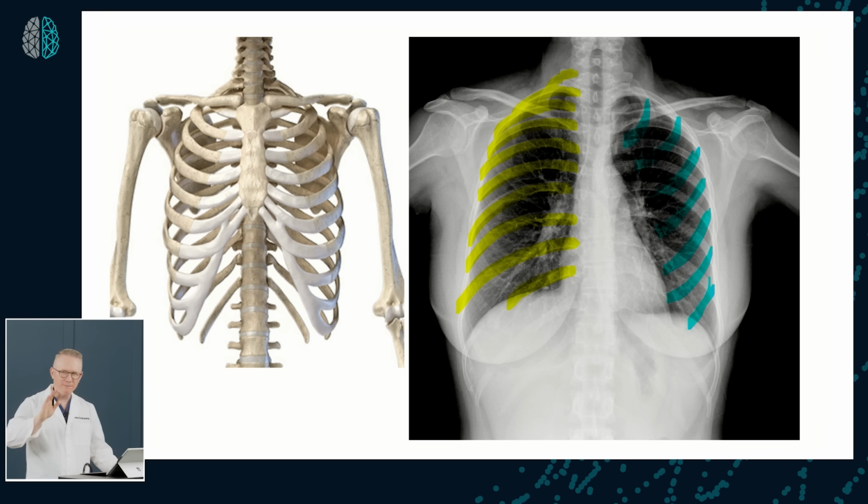And again, remember that 5 to 6 anterior ribs is adequate for showing appropriate inspiration and the visualization of the lung fields and the markings that you should be looking at. And so that's how you can identify those. They look like whiskers crossing the lung fields, and they lose their view as they get closer to the cartilage, right? They become less dense, okay?